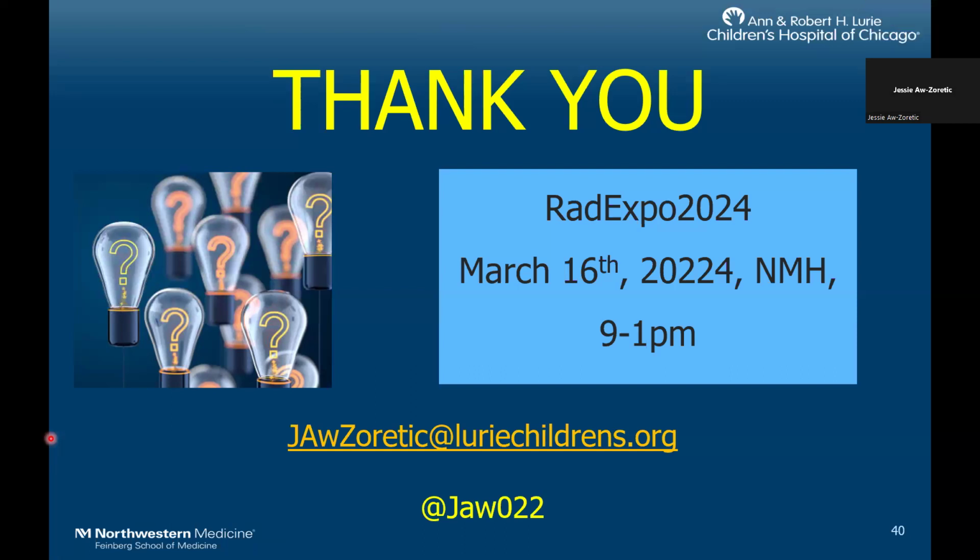Right. And one thing I want to highlight to trainees is that if there is no presence of lactate on the MRS, that does not exclude ischemic HIE, especially if they've been cooled.